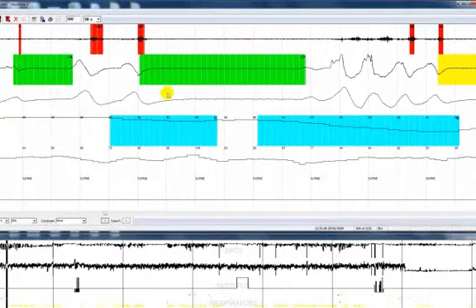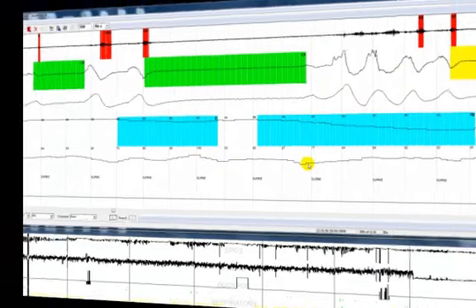Both preceding and following the respiratory event, we have sinusoidal effort and airflow, and of course we have no snoring during the apnea event, further confirming cessation of airflow, and we have variability in the pulse rate signal. This is a classic textbook central apnea event.